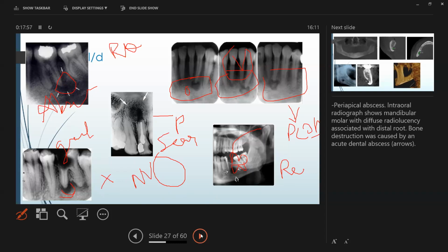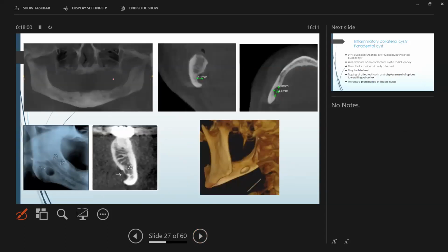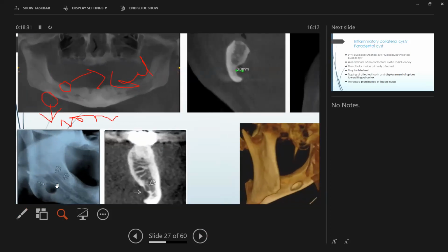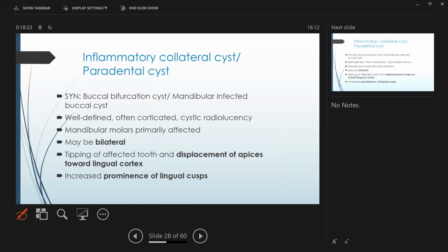Okay. Okay, good. And this one is again another, like you will have a periapical radiolucency, but for all the periapical radiolucencies, you will have above this the mandibular canal. You can see the mandibular canal. So when it is above the mandibular canal, it's most likely odontogenic lesions. But when it is below the mandibular canal, then it's most likely non-odontogenic. Okay, so this is one of such kind where you have a cystic lining, you can see here very clearly there's a sclerotic border and it mimics a cyst, or you can even tell a residual cyst.